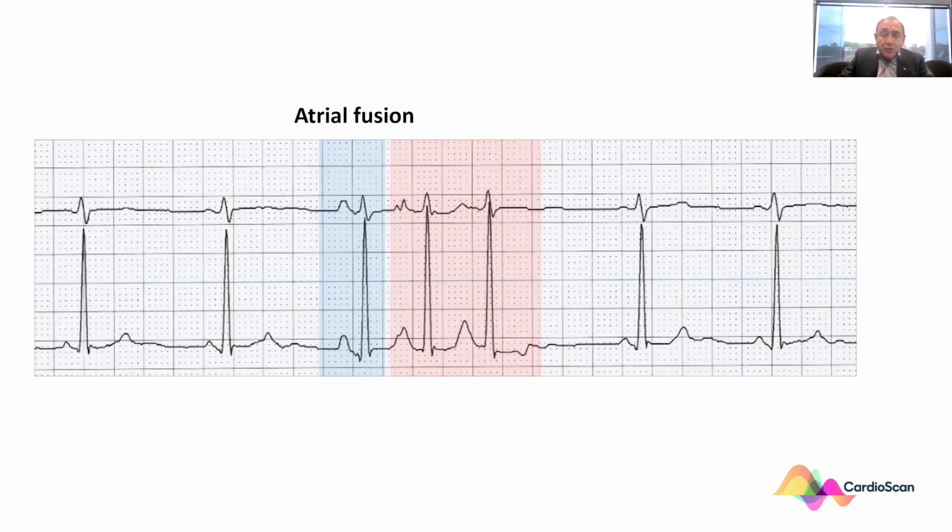An atrial fusion beat. So if that's the case, this is an atrial triplet, and you can see that where the red arrow occurs within the fusion beat, the sinus beat starts later, and it is the atrial ectopic that's earlier, and the two of them fuse together. Both contribute toward atrial depolarization.